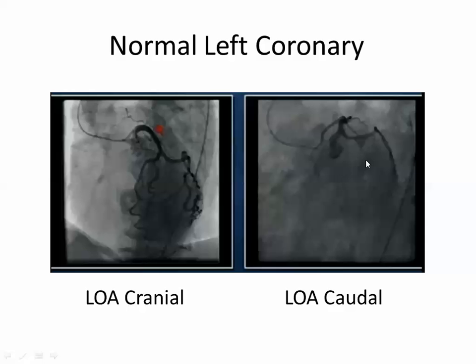What's this view? Shaft. So this is the spine, the aorta. So the direction of the ribs will be like this. So what is the view? It's LAO. Caudal or cranial? Caudal, because no diaphragm. Yes. So this is a spider view. Septum, anterior, lateral, inferior. So what's this vessel? LAD. What's this vessel? LCX.